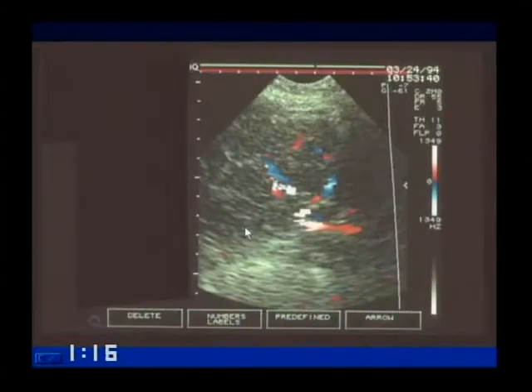And there's a patient with splenic sequestration, in acute pain, a known sickler. Granted, on any one image there's no way to show this, but if you get used to the particular Doppler gain settings that you use, or if you use power Doppler, you'd see a lot more peripheral flow in the spleen, and only the central vessels are lighting up at this particular gain setting.